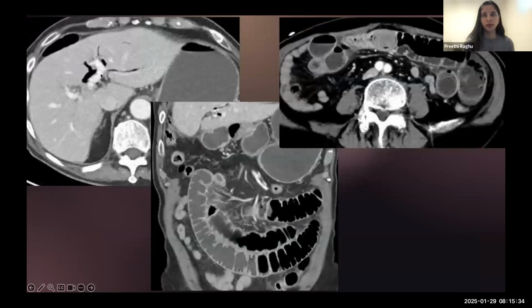And then one of my favorite cases of pneumobilia and dilated ducts here, this was a patient who came in with severe abdominal pain, and in this top left image, we can see clear gas within the bile ducts, pneumobilia. And this patient did not have a prior known history of surgery or sphincterotomy. And then as we're looking through in the second image here, we see that not only was the stomach dilated, but much of the small bowel was dilated.